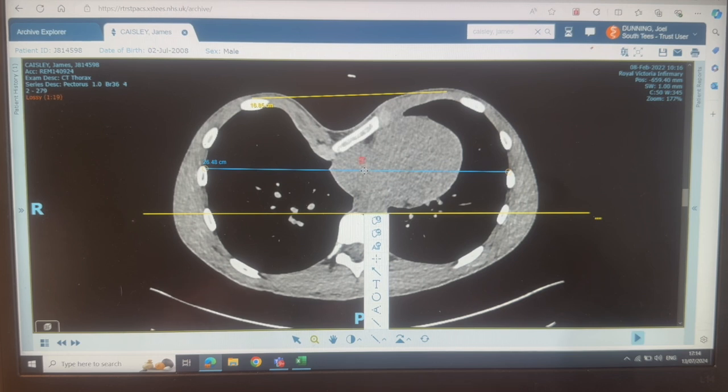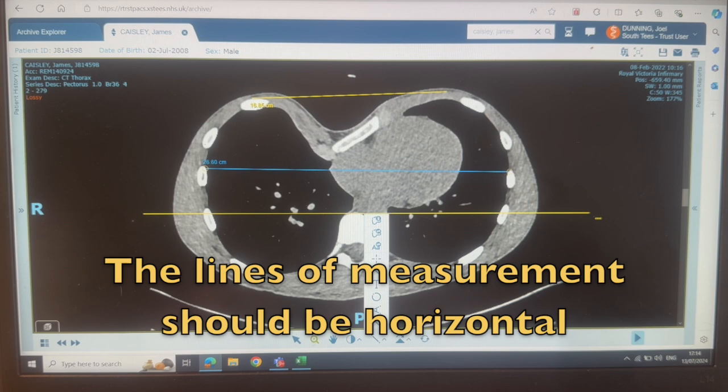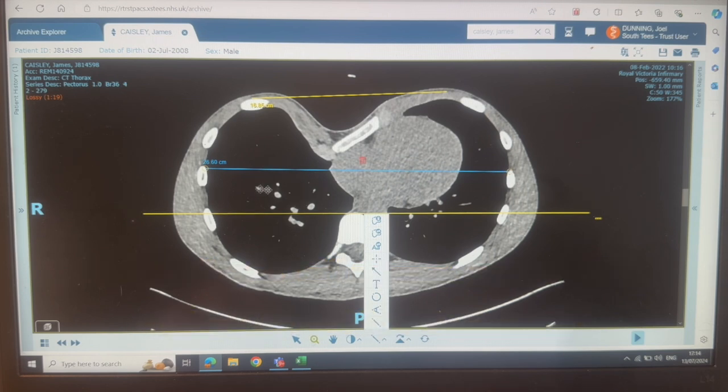We got a lot of these tips from the CT scan radiologist from Phoenix in the Mayo, who's done 1,200 of these. He likes all these to be axial. He doesn't like you to angle them up or down. He likes axial measurements, so just be aware of that. So I put these 3 lines on first, and you'll see why that's helpful in a minute.